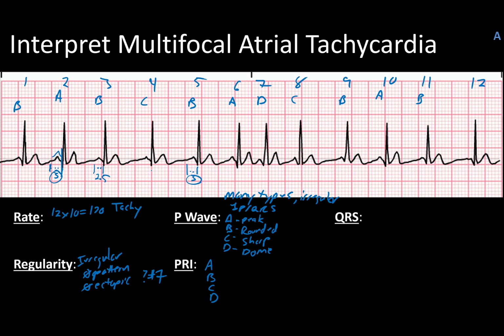And if we want to measure C, it's a little bit more difficult to tell where things really change for him. It could be this wide or a little bit more narrow. Kind of hard to tell. But this one here, that little change in deflection right there gives me the 1, 2, 3. So 3, 3, 3.